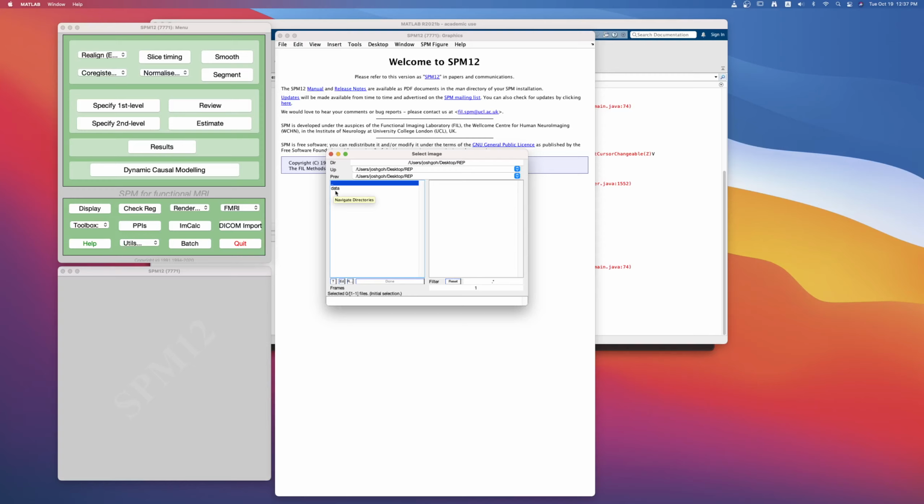In this MATLAB interface, clicking twice will make you go up twice. Clicking twice to go down will make you go down two levels. So that's a habit you have to get used to. So in MATLAB, this selection mode requires you to only click once.